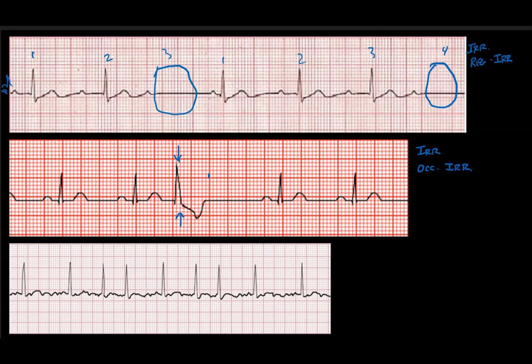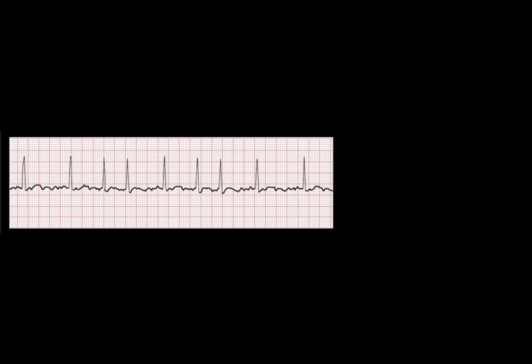We take a look at our last ECG, and again, it's kind of like the first one. You can take a look at it. Actually, it's like the other two, and you can realize that it isn't going to make a whole lot of sense for me to realize that this is an irregular rhythm. So if I want to look for a pattern to it, calipers, which I'm going to show you right here, okay?